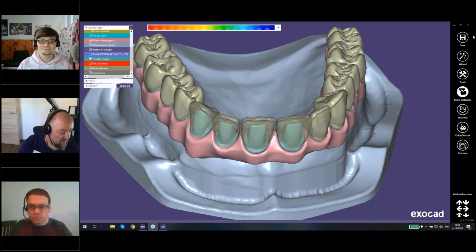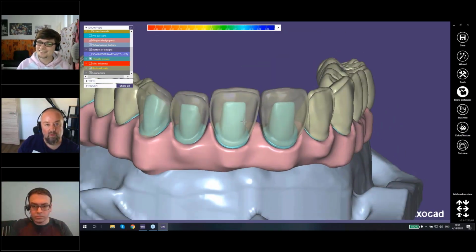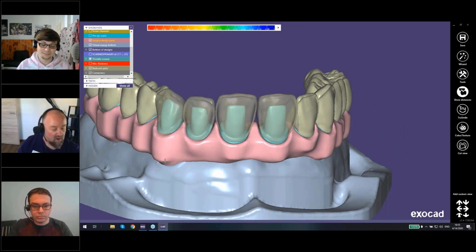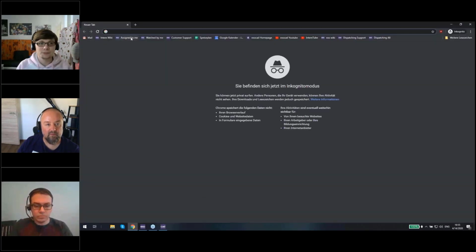Friedemann, maybe now we could show shortly the multi-level shrinking, or did you do that already? I already showed it. Oh, I've already shown it. Okay. Then you could maybe just show on our website the page where to download all the libraries and just explain it. Wow. But I'm doing this in private mode.